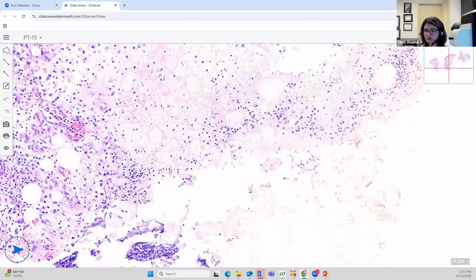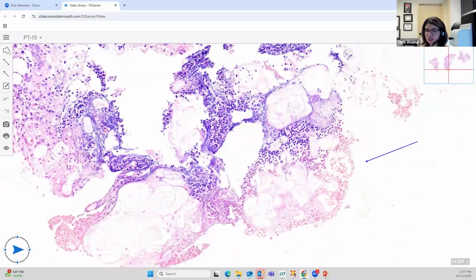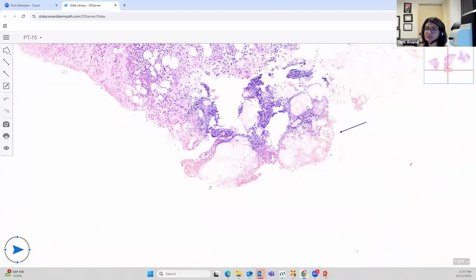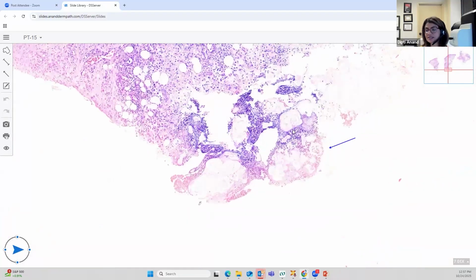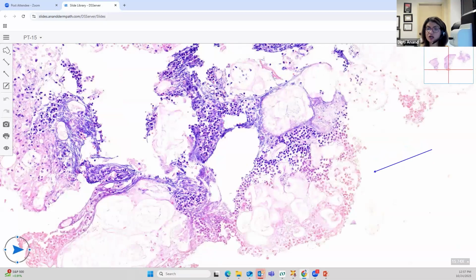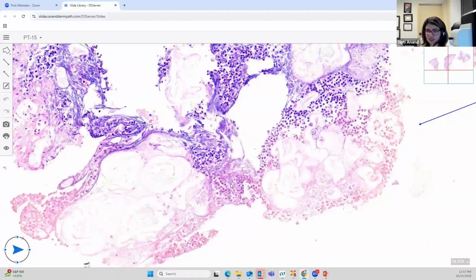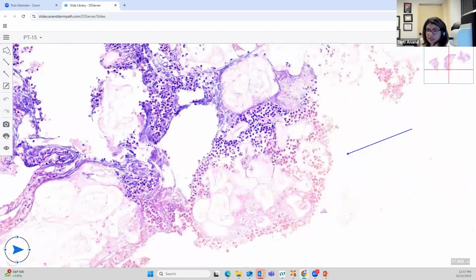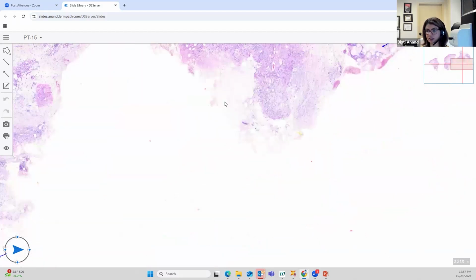But then when you're looking around the fat, you see all these ghost adipocytes. You see how the adipocytes have left behind their outlines, and in the lumen is this basophilic debris, which is from the fat saponification, because all the lipases have released the calcium and have caused this fat saponification, produces this basophilic debris. So it is a bluish fat necrosis with these ghost adipocytes. Does everybody recognize the ghost adipocytes? They're nicely highlighted in the biopsy in here. The arrow is highlighting them. That is when you will think about pancreatic panniculitis.